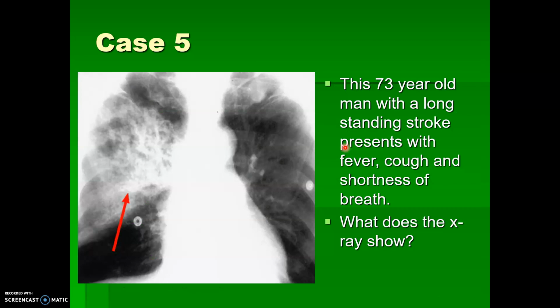Here's a 73-year-old man with long-standing stroke who presents with fever, cough, and shortness of breath. Pause the video. Tell me what you think you're seeing.